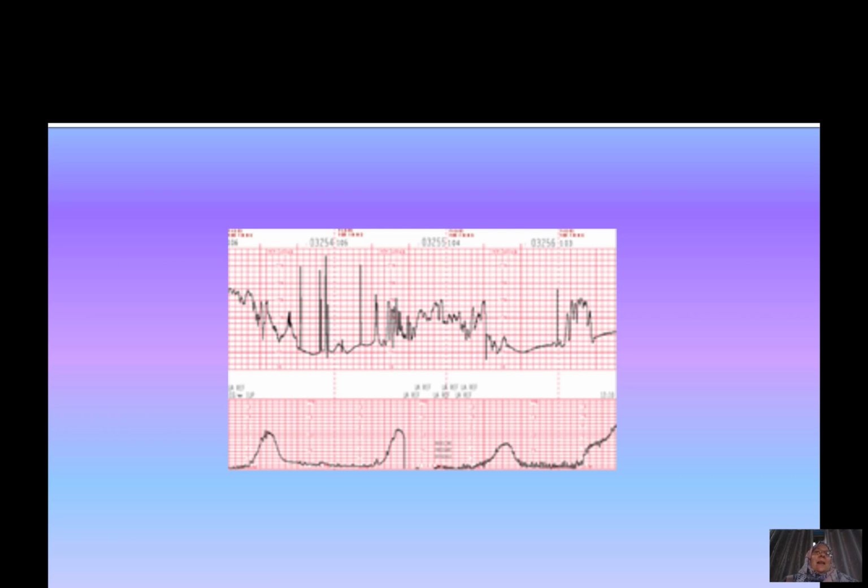If you look at the start of the CTG, you see a baseline, and then you see the drop in the baseline, followed by a brief stint of actually bradycardia. This is more than just a prolonged deceleration, it's a bradycardia. And then the baseline recovers to about 120 in the middle, and it remains at 120 about 5 minutes, and then it goes down again, and another deceleration for about 4 minutes when it recovers again.